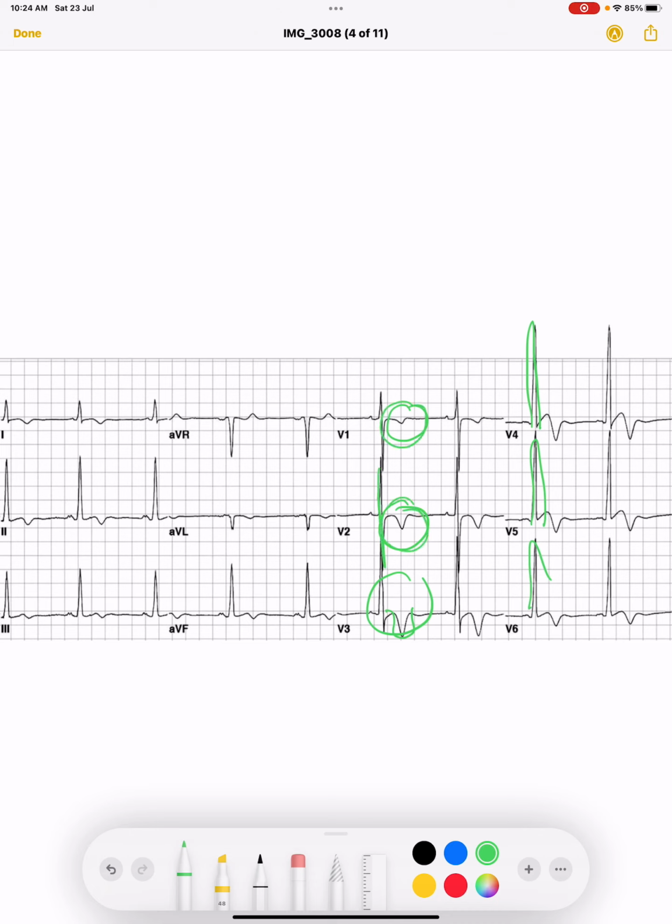This was the ECG of apical hypertrophy. This is hypertrophic cardiomyopathy, apical hypertrophy, deep T waves with huge QRS complexes. Huge QRS complexes show hypertrophy, and deep T waves show apical hypertrophy, but there was no abnormality in the Q waves.